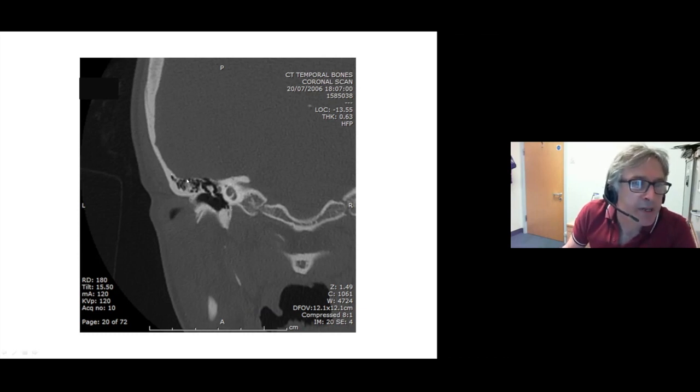So this is a coronal image through the cochlea, which we can see quite nicely here. So we're relatively anterior. This is largely malleus here. You can just about make out the tendon for the tensor tympani. Remember this space, Prussak's space, just at the top end of the tympanic membrane, just below scutum, that little recess there, that's where pars flaccida cholesteatomas start.